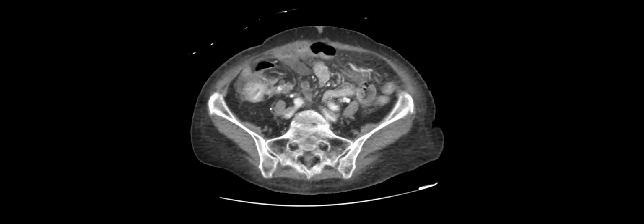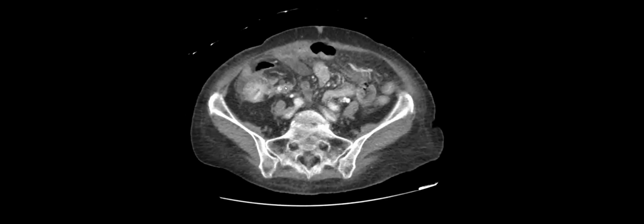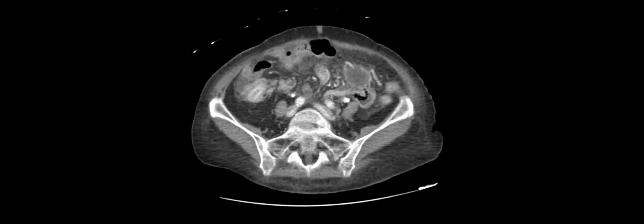I wanted to show this because the prelim read was that there was colitis here, and it does look pretty hyperenhancing. But to me, the clue is that there's confluent lymphadenopathy coming right out of the mass. It could mimic colitis. It's very hypervascular, a long segment, but here we can see either direct extension of tumor or this confluent lymphadenopathy coming right out of the mass, which makes it extremely suspicious. So this was a colon cancer with extensive liver mets. The colon cancer was only this big, but it had already spread pretty extensively in the liver. So always follow the colon, and if there are adjacent lymph nodes, be very suspicious.